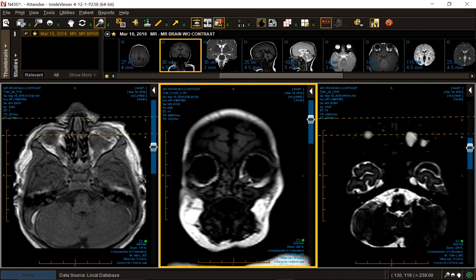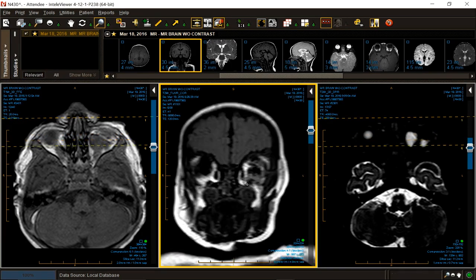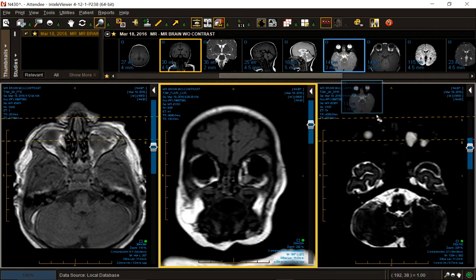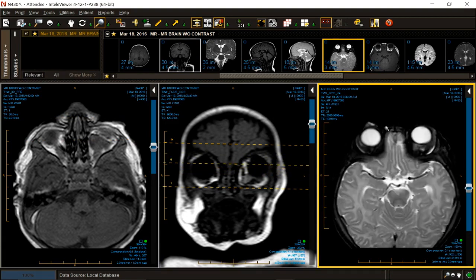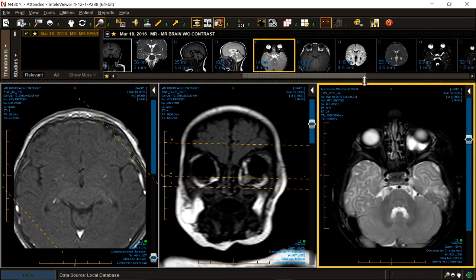It's a little highish in signal, right, on the T1 non-contrast? It's next to a muscle, but it's not arising from a muscle. It has a little bit of extraconal extension. The signal of it is predominantly high on T2.